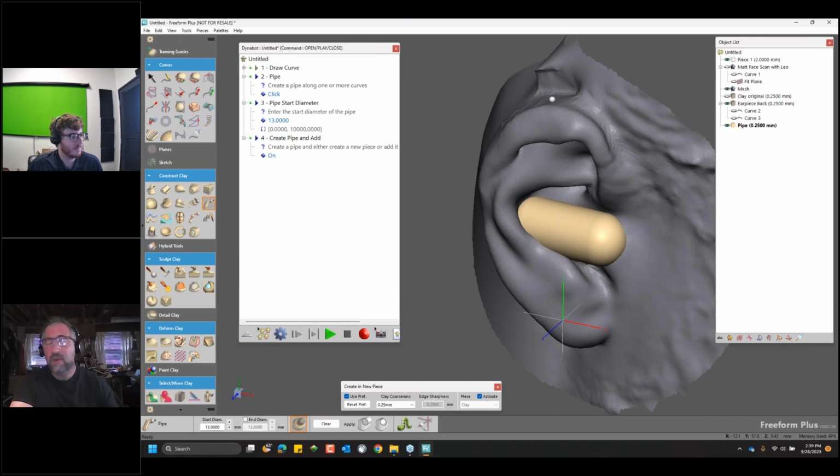It gives you a lot of flexibility and the ability to make changes where more automated tools that don't have the rest of the design pedigree can't allow you to fix and continue working. If something in the data is challenging or if there's any type of issue, you have an entire working suite of tools that are built around the idea of manufacturing to fall back on. That is one of the most important things with this entire package.